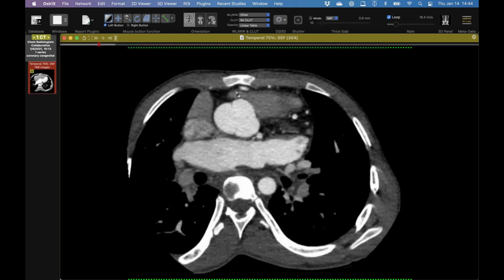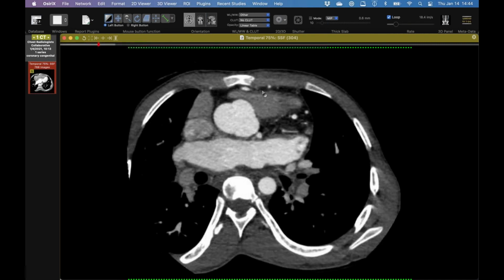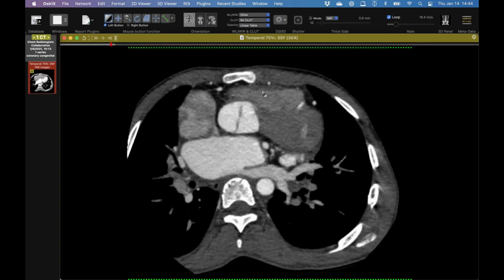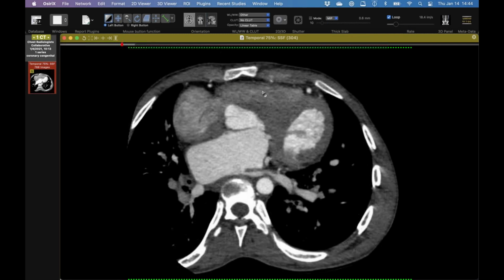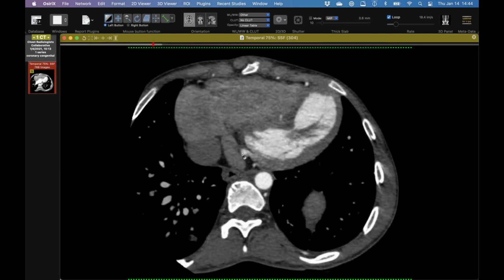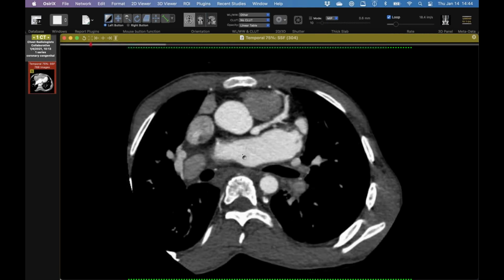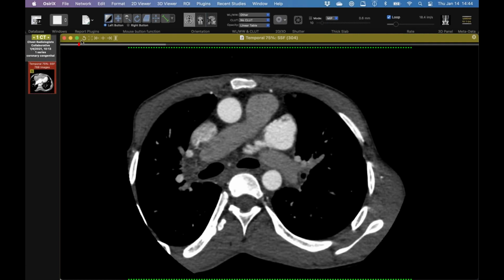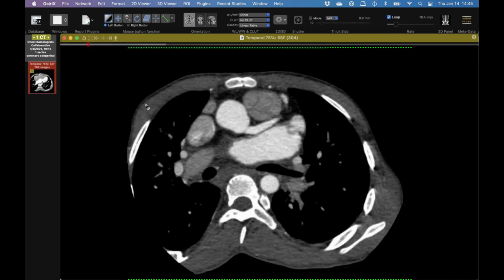And then in the same week, someone sent me this one. My fellow Melissa sent me this case, I believe. This is a 16-year-old and has a nice, big, juicy left coronary. And you can see there's a branch coming off the LAD that wraps around the infundibulum there and goes out here and becomes the right coronary artery. So it's just a single coronary arterial system with a benign course of the right coronary going between the sternum and the outflow tract there.